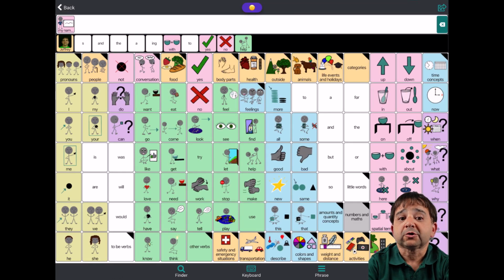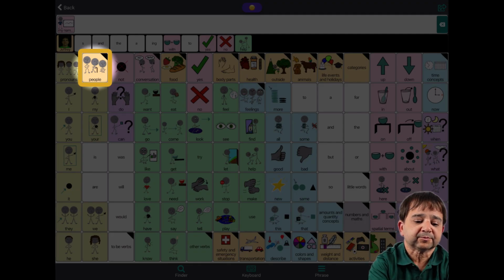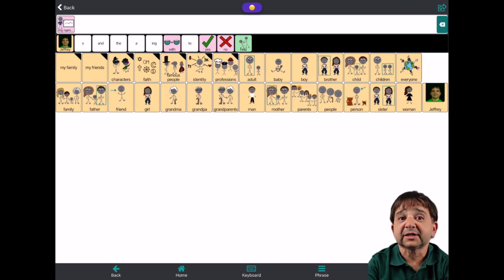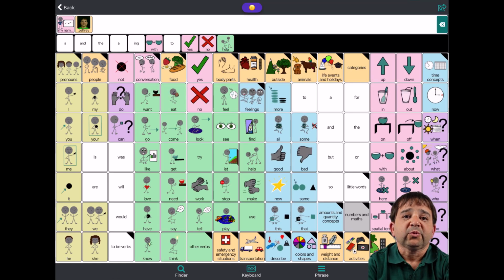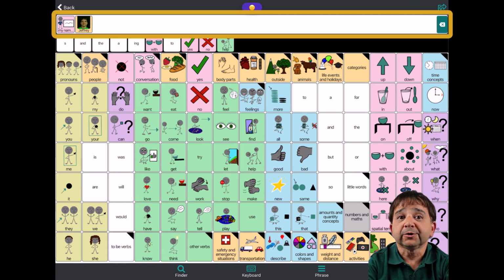And now I'm going to go into People, and then select Jeffrey. And now I'm going to tap in that white area at the top of my screen, and the device will read my sentence. My name is. Jeffrey.